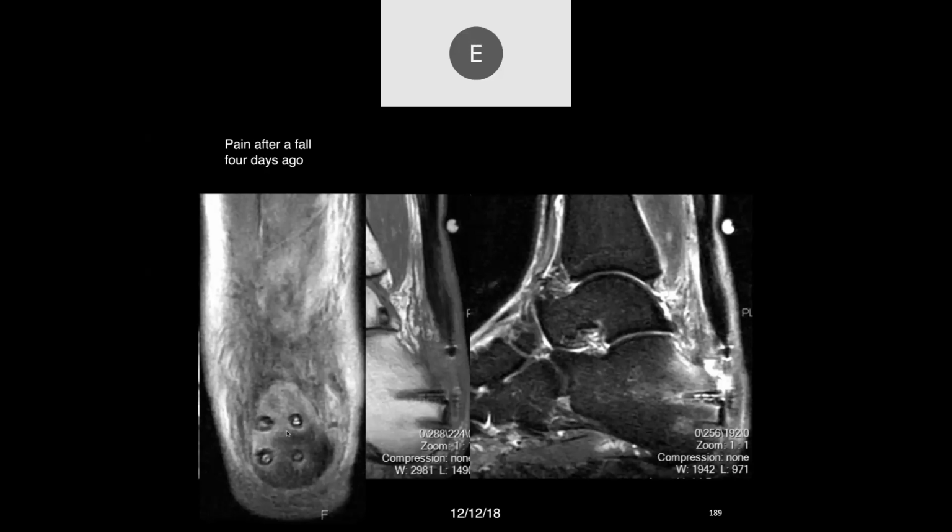So you can see that they did kind of a double row technique with 4 suture anchors, and this is just going through one of the rows of suture anchors. All you do with those screws is just damage more tissue, and I've never liked doing screws in this kind of area for tendons. It just doesn't appeal to me.